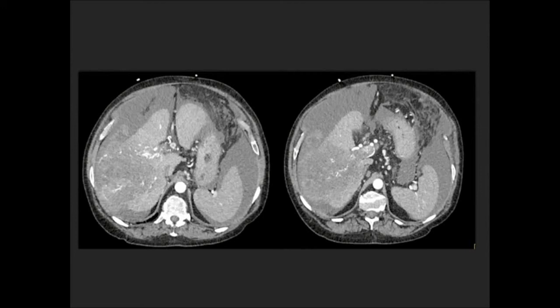Now, lymphoma, I once saw a case of lymphoma that bled, but this is not lymphoma, and this is not a hepatic AVM. You can argue, is this hepatic adenoma or is it hepatoma? Both of them can rupture and spontaneously bleed, but with the underlying cirrhosis and the really impressive neovascularity in the liver lesion, this is going to be a hepatoma, and this indeed was hepatoma.